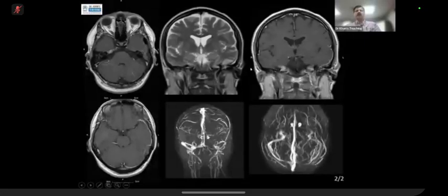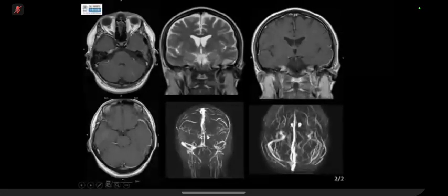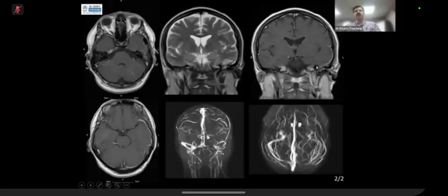So, what is happening on this MR? If you can concentrate here, concentrate here. This is that gas locule. How will you tackle it? What will you say? Over to you.